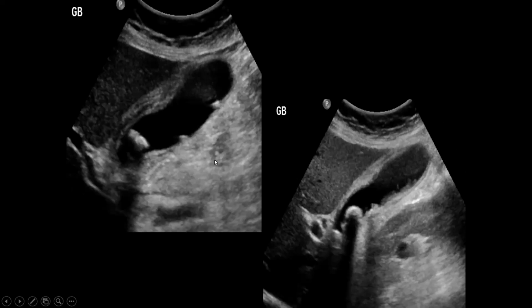And most importantly is the tenderness. We call this sonographic Murphy sign. This is very important to see whether this thickening is due to acute cholecystitis or due to other causes. The thickening in the gallbladder wall has a very long list of differentials. Some of them include neoplasms, infection, hepatitis, hepatic congestion, reactive thickening due to adjacent infection or inflammation such as pancreatitis or pyelonephritis or diverticulitis. If the patient has third spacing, they can also have edema in the gallbladder wall.